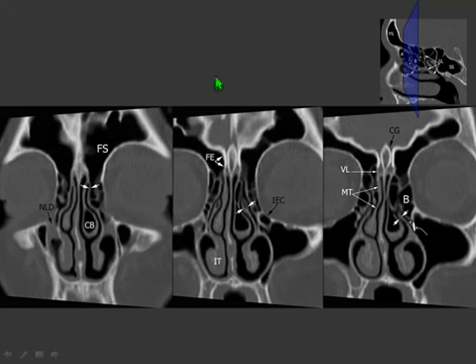Because in this case, if you look at the frontal sinus, the mucus coming from the frontal sinus will pass necessarily medial to the vertical process of the uncinate. If you step a little bit behind, you start to see that the infundibulum is narrowed by the presence of a variation, which is the infraorbital ethmoid cells, and going again posteriorly, we are in the central portion of the nasoethmoidal cavity we already discussed.